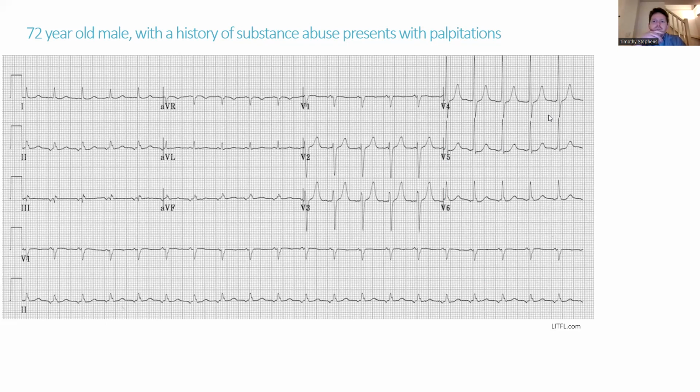Somebody's put junction also. Yes, fine, that's good. Somebody's put atria and an ectopic. Yeah, it could well be. But the key thing is at the moment we're saying that this is not from the sinus node and we're thinking it's coming from the atria. Yes, absolutely. So what is this?